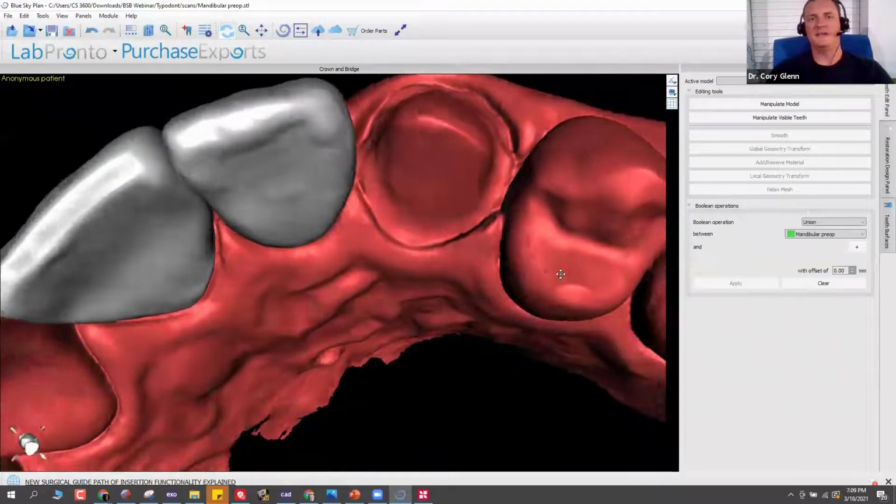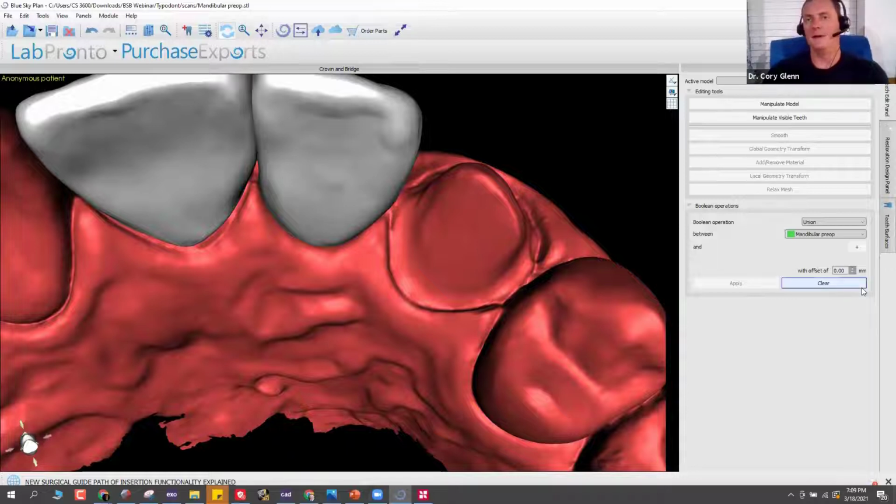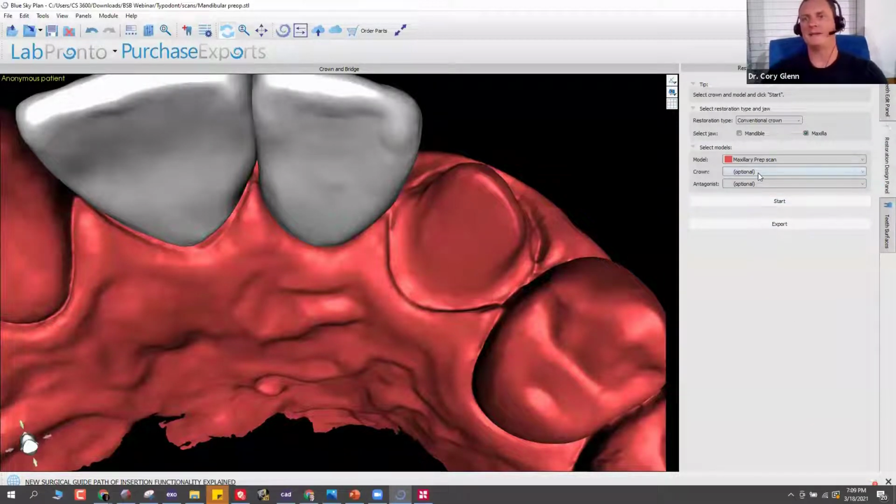Hypothetically, let's say that we designed all these teeth and we positioned the margin of this tooth to match up exactly with the margin of that model, where your veneer margin was. You could simply do a Boolean subtraction of that underlying model plus an offset of 0.2, which it allows right here. And there you have your veneer. So it's not a dedicated workflow right now, but it's coming and there are hacks to do it right now.